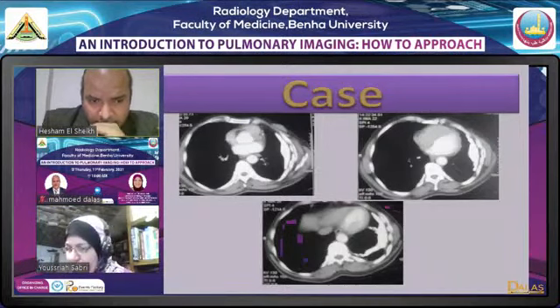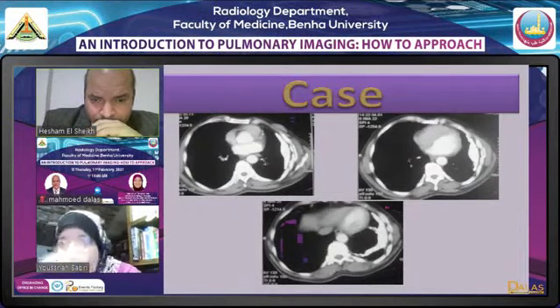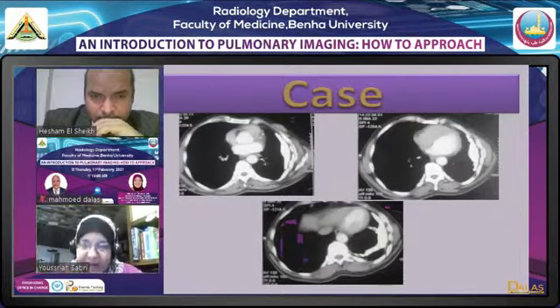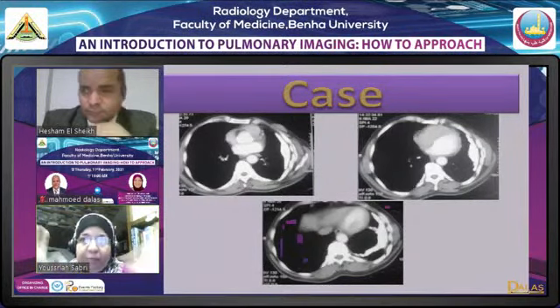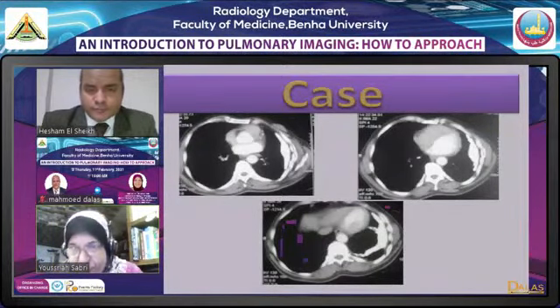Another question, دكتورة يسرية, how to differentiate cicatricial fibrosis from honeycombing. قلنا ما فيش حاجه اسمها سيكاتريشال فايبروزس. يعني سيكاتريشال معناها فايبروزس، هي سيكاتريشال كولابس. تمام؟ السيكاتريشال كولابس تاني بيبقى لوب اوكي ماركت بفوليوم لوس. الهاني كومبينج bilateral fairly symmetrical subpleural predominantly basal with filling the pleural recess of clusters of cysts, total different appearance.